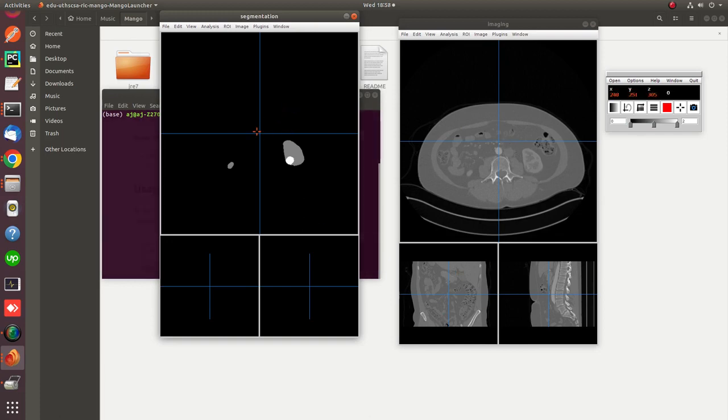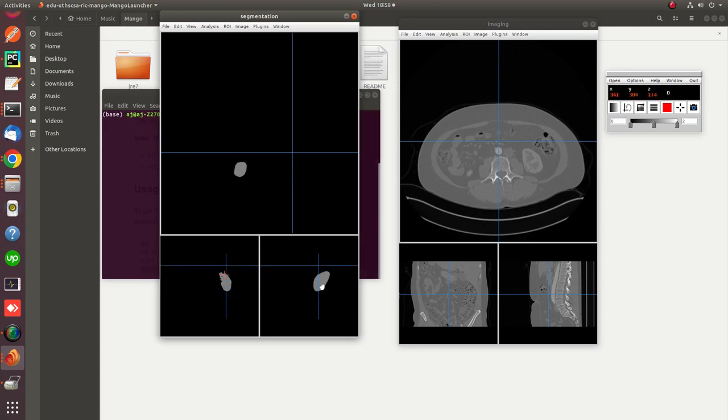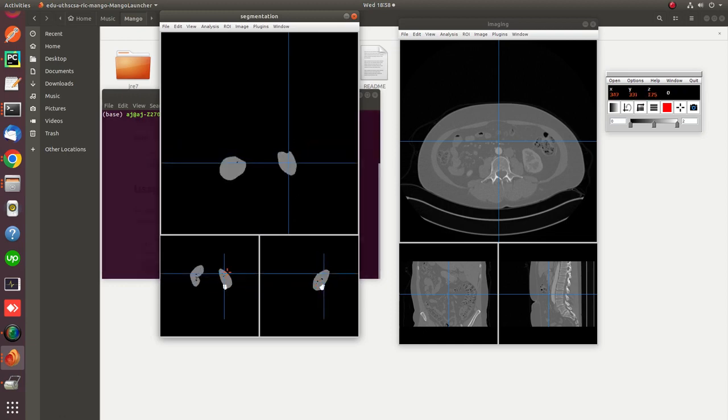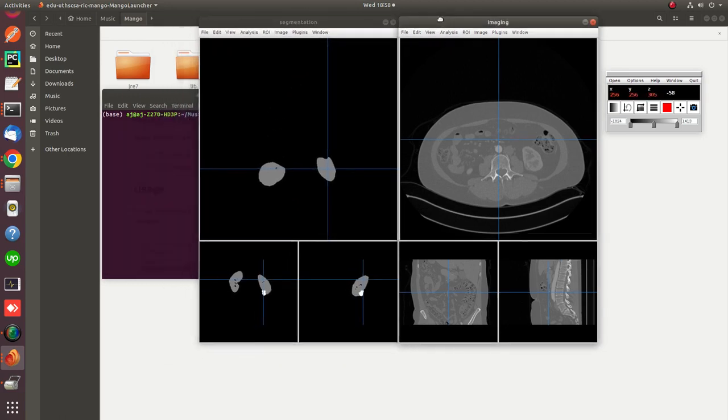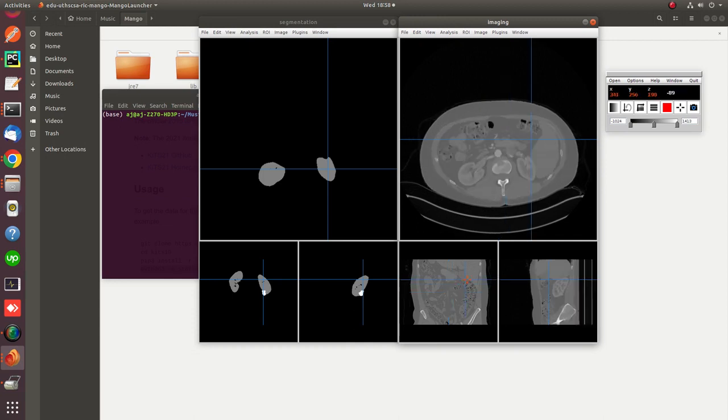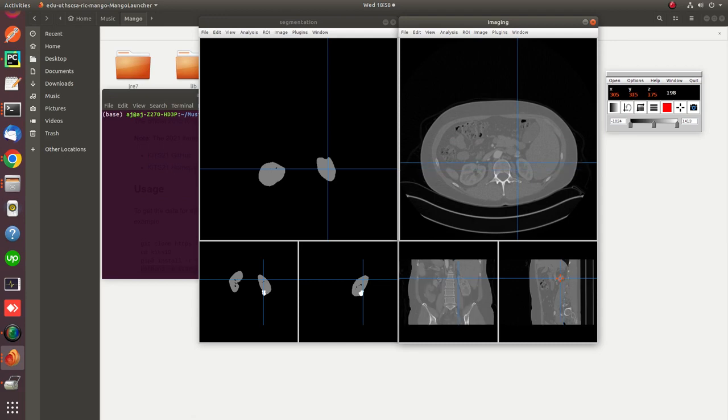let me show you how you can visualize the dataset. Let me reach both kidney portions, like this. Now these are visible pretty much. Okay, and let me align them. I guess I'm done now. So guys, you can see here, this is the input image and this is the segmented image.